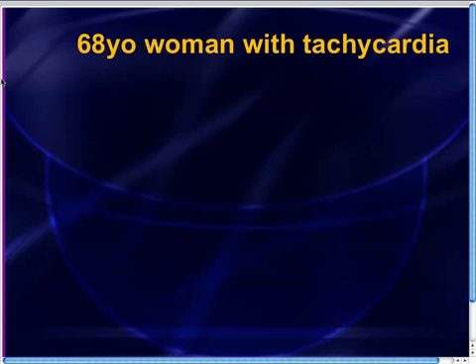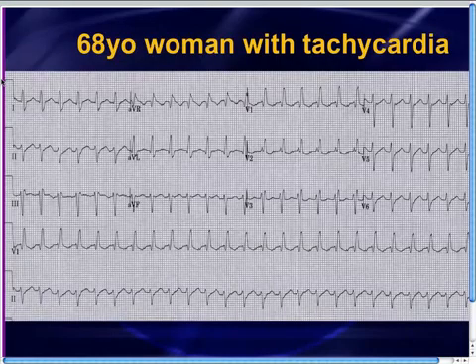So, of course, we got a 12-lead EKG to find out what in the world is going on when she got brought up front. And she's got a wide, complex tachycardia. So let's forget about her foot. It is completely unrelated to our main concern. I think maybe she had a little crack between one of her toes and a little athlete's foot or something like that. Whatever. But she's got a tachycardia which is wide, complex, and regular.